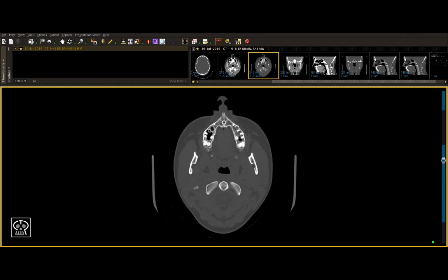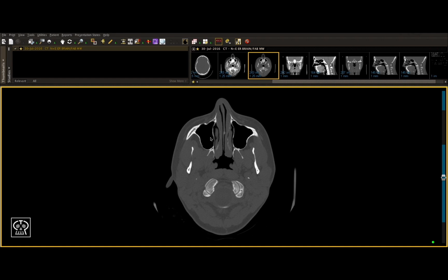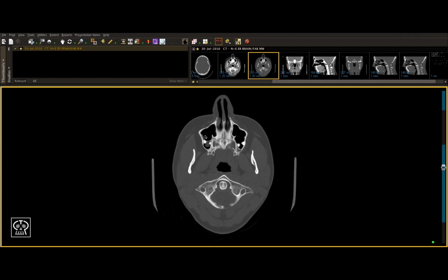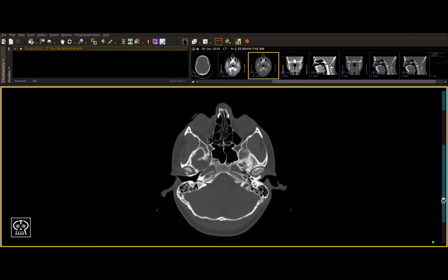Therefore, the first region I look at is the maxillary sinus itself and the anterior and lateral walls, looking for any step-offs or fractures. Once again, remembering that hemosinus, or blood in the sinus, and fluid in the sinus can act as a clue that a fracture exists. However, you always need to examine because hemosinus may not always be present. After looking at the anterior and lateral walls, scrolling all the way through the sinus, we're ready to move on.